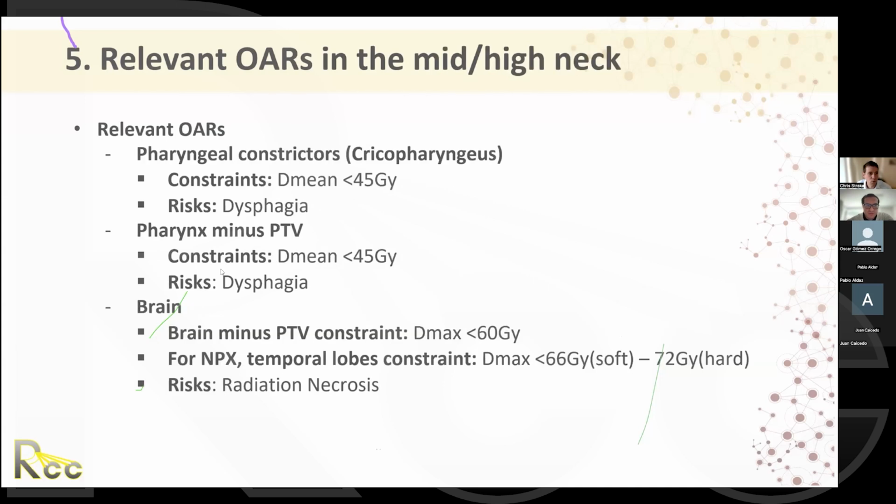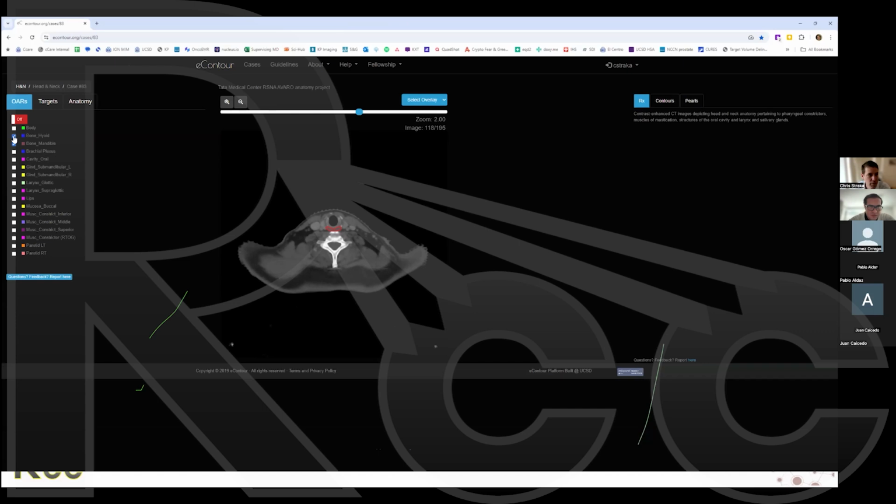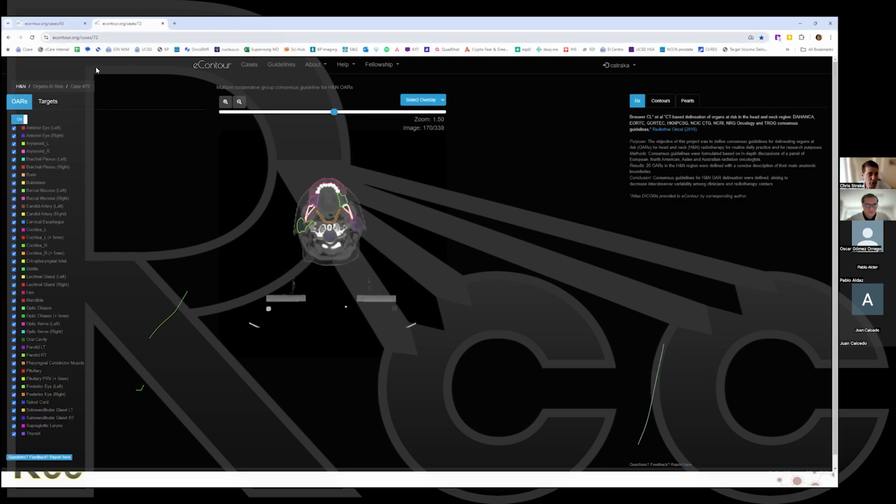Okay, so we'll start here and let me pull up. We haven't used this tool yet, but this is a website called eContour, which I highly recommend. I also have this linked at the end of the talk. There are many cases across all disease sites that have wonderful contouring tools you can turn on and off, basically any or all of them. I have a couple that are just anatomy, and the vast majority are actual cases with GTVs, CTVs, PTVs, targets, things like that.